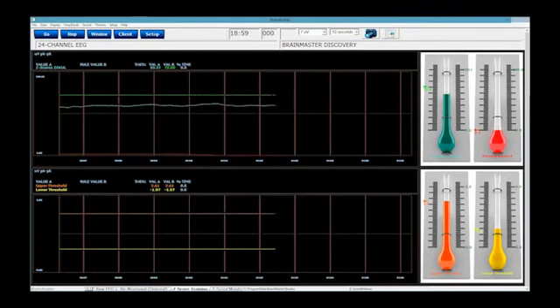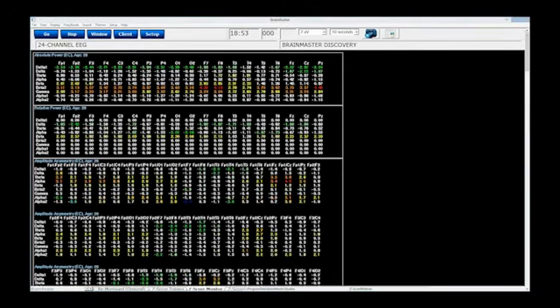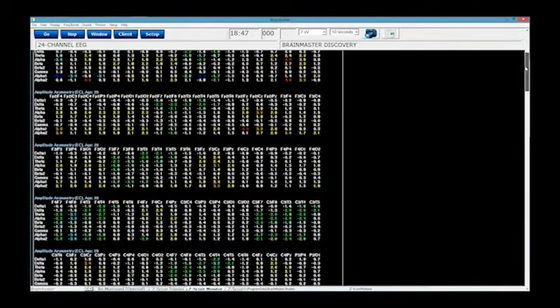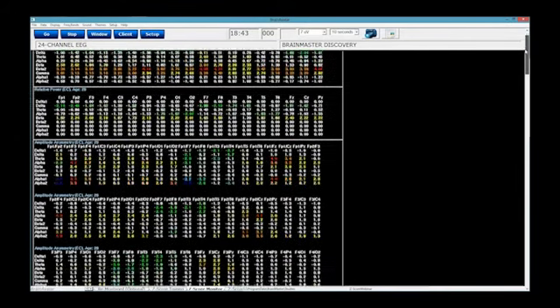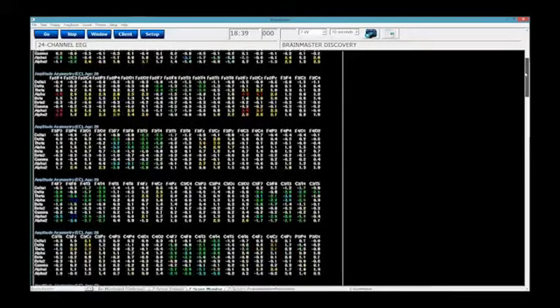Now, let's go to the ZScore Monitor page. I really didn't show anybody any of these screens before, but I want to show you the difference right now. This is going through all the different Z-scores that we're looking at. You've got your absolute power, your relative power, and all of your different asymmetries right here.